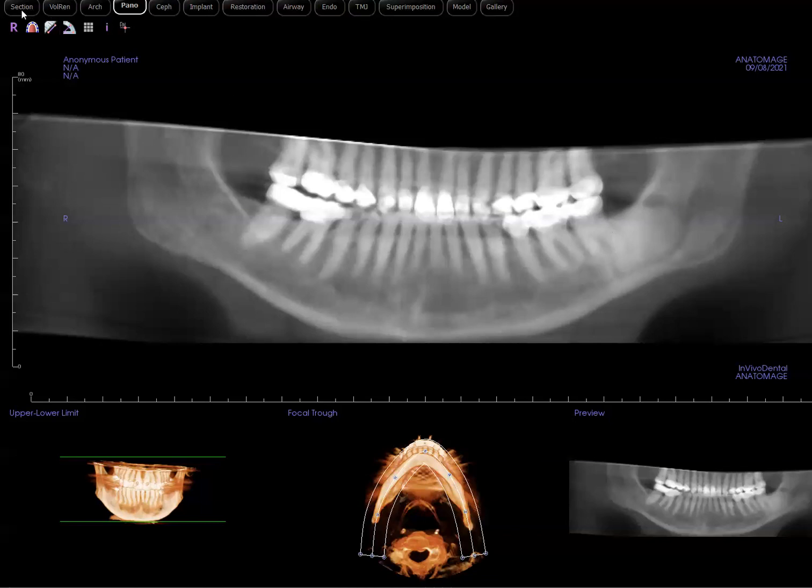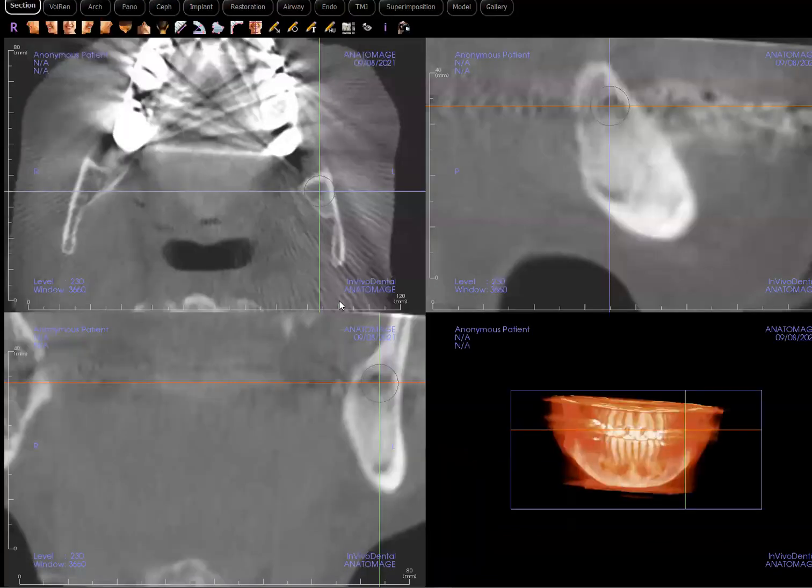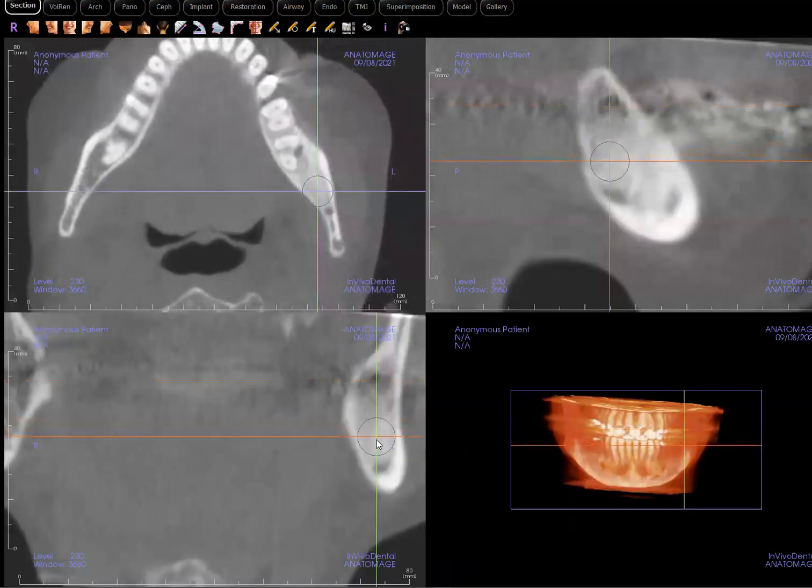Now, in my previous video, I talked about an odontogenic keratocyst in someone in his or her 20s, but this is in the 50s. If you recall from that video, there was no evidence of root resorption or displacement. And that's a similar feature that we see here. I don't see any overt evidence for root resorption or displacement. So now let's dive into the area of interest.